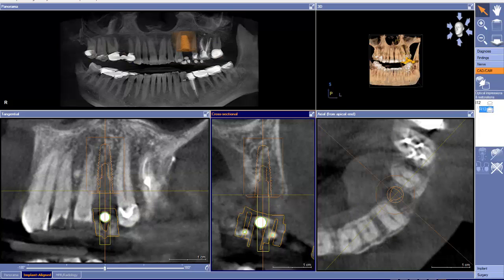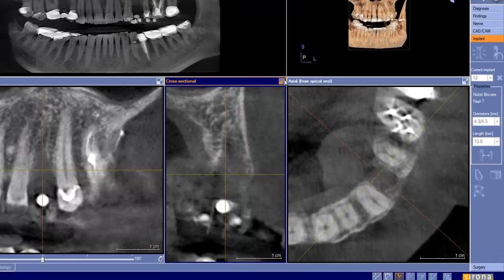So what I'm going to do is turn everything off for the time being so that all we see is just the natural teeth and the bone there. In fact, I'll go ahead and turn the implant off as well. Now when I'm looking at a case like this, everybody's going to do this a little bit differently, but in the beginning, mentally, this is kind of what I'm looking at. So if you don't mind, I would like to draw out for you what I'm looking at here.